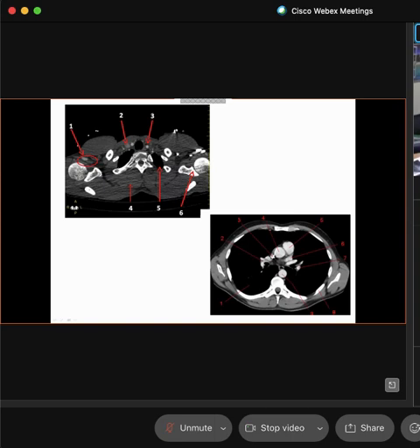Look to see what you have. Look at the shape. It does not change. Okay? Look to see what you have. Now let's take a look at this one, Aurora. Here we have the vertebrae. Look for your vertebrae. We see a lot of space around, and immediately anterior, we see some areas of brightness. So around the vertebrae, we see lots of space.